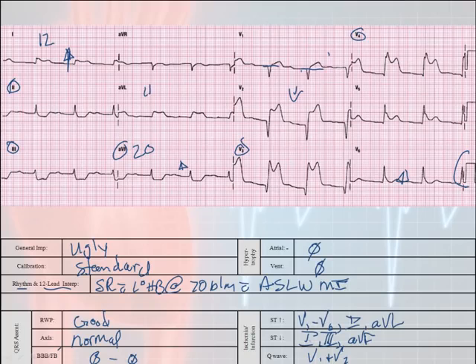Do I have any depression? Yes, I do. I have depression in the inferior leads. Anteroseptal lateral wall MI with reciprocal changes in the inferior leads.